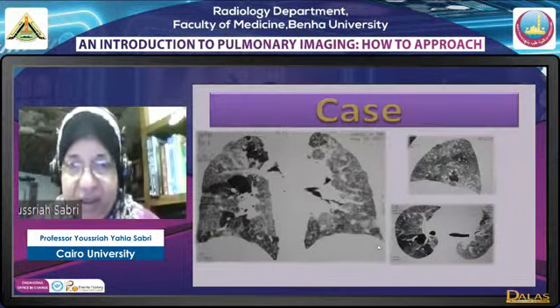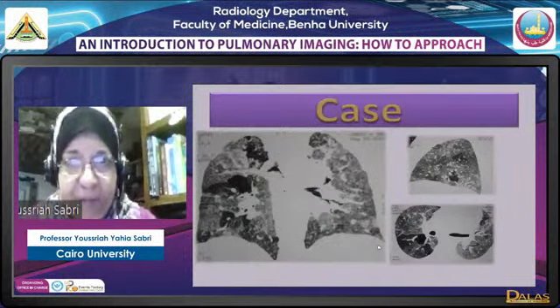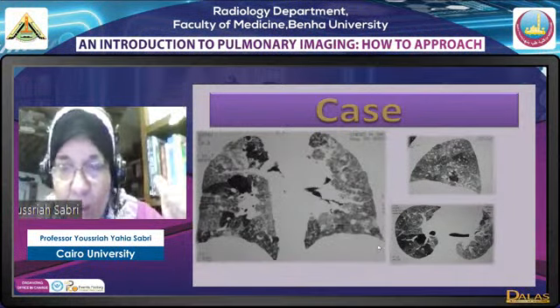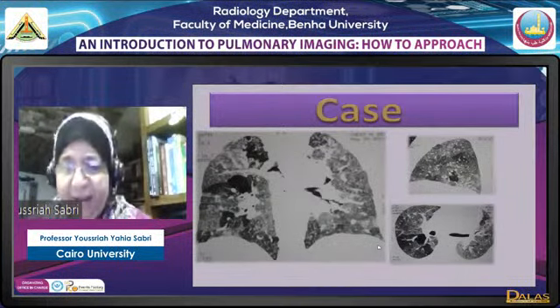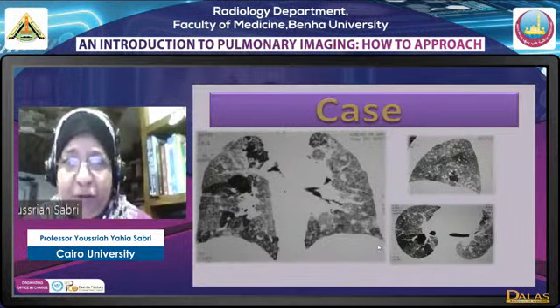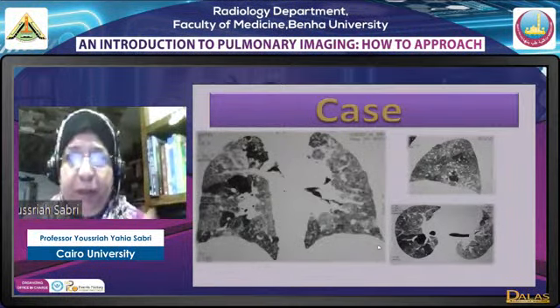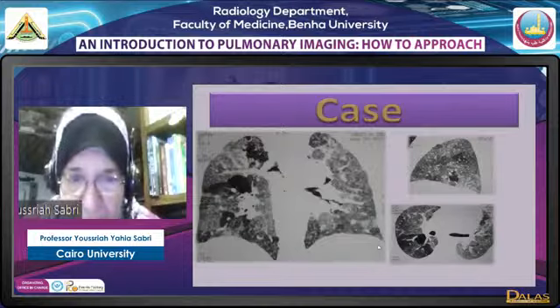But in high resolution CT, there is a pathognomonic appearance. This is the pathognomonic appearance of subacute hypersensitivity pneumonitis. What is subacute hypersensitivity pneumonitis? Well, it is considered an interstitial disease. It may be considered also as an organic pneumoconiosis. The patient inhales some infectious organism, inhales certain organic dust and so on: patients raising birds, patients working with hay, farmers, all are subjected to such disease.